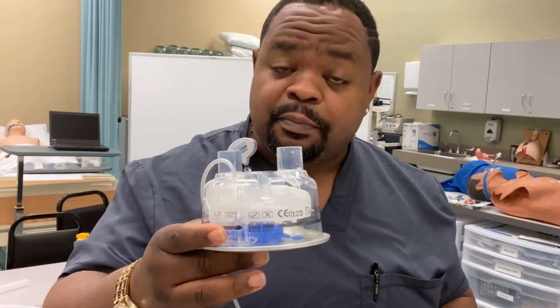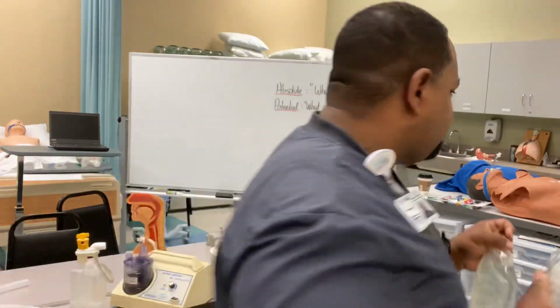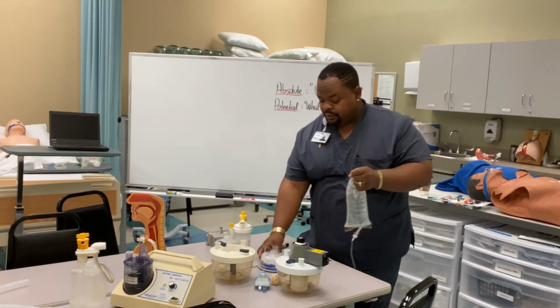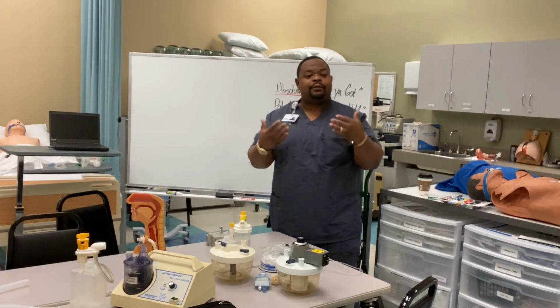Very important as a therapist, look at your water bag. When you come on the shift and there's a therapist leaving, make sure the water bag is not bone dry. If this water bag is completely collapsed and dry, you make them change it because you are responsible. If I'm your manager and I come in at 9 and I see this patient's bag is completely dry, I may reprimand you. But you may tell me, well, Mr. McCarthy, it was like that when I got here, right? That's even worse because you know how important humidity is and you knew it and you left it, right? So that's even worse. So make sure you have accountability, guys.